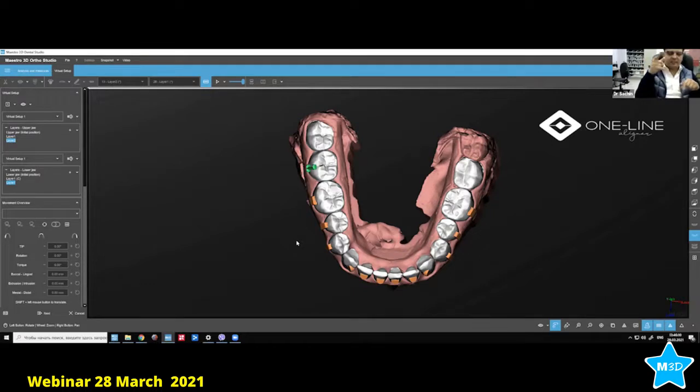So I make the last aligner with the CA sheet, which is a little hard compared to the Pro Plus. Or I use a tagless. Tagless is more hard. Then you can just press the teeth into place.